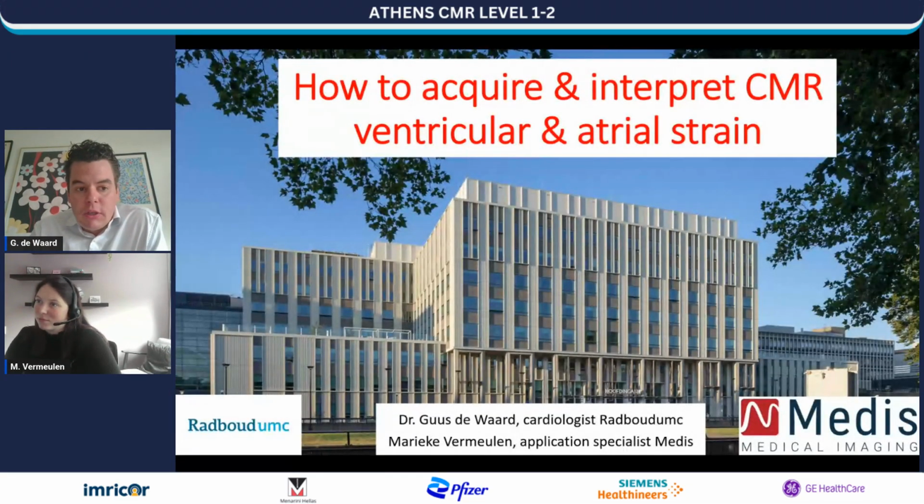And what we'll be discussing in the next half an hour probably is going to be on how to acquire and interpret CMR strain, but also we will show you the basics of how to perform quantifications of the left ventricular volumes and the right ventricular volumes.